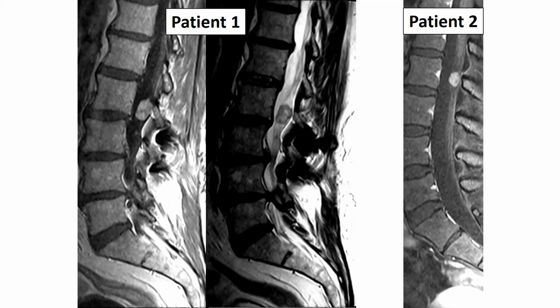Now I see a few people are just giving one answer. These are 2 different patients. Listen, these are different diagnoses. They are not the same. Now I can see people responding and they're not saying 1 or 2. They're just giving a generic answer. Well, come on, you have to commit. I'm seeing schwannoma, I'm seeing myxopapillary ependymoma, and you have to say which one. Okay, Andrew Gilbert. All right, patient 1, I've got schwannoma.